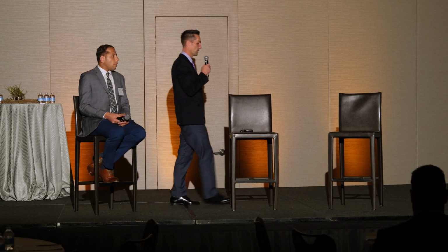So we're going to show the ease of use of the applications and being able to post-process the CT software. Patrick is going to go back behind the scenes, and I'll walk through how this post-processing is done with automation.